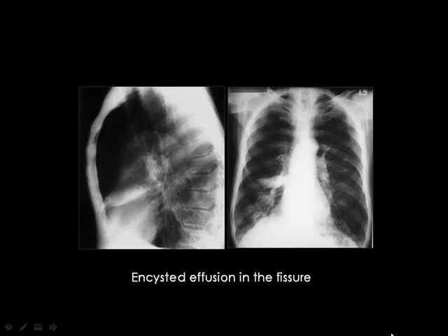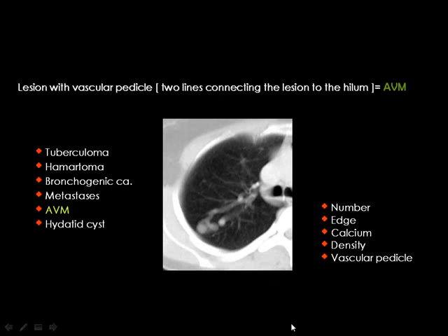Then one of you may ask about the encysted effusion in the fissure. The encysted effusion is not a nodule or a mass. Number one, it is elliptical in shape. Number two, encysted effusion is not in the lung. Encysted effusion is in the fissure. Then you can easily discriminate between the hydatid cyst and these two entities.